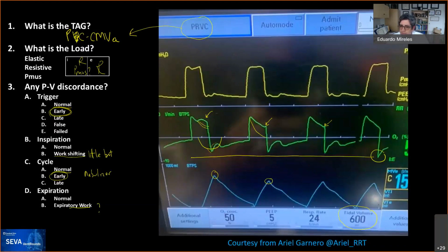So, alrighty, there's a couple of questions here, Rob. So let's try to get at them. The first one is, I didn't understand why the bump in the expiratory flow is not a false trigger. You mean a failed trigger, Hara? Yes. If we didn't know what we know now, I would have called this a failed trigger. If you eliminate the first breath, I would have probably said that this was a failed trigger on this patient, and with the presence of increased resistance, that's what I would have said.